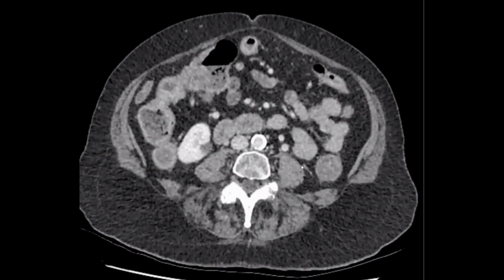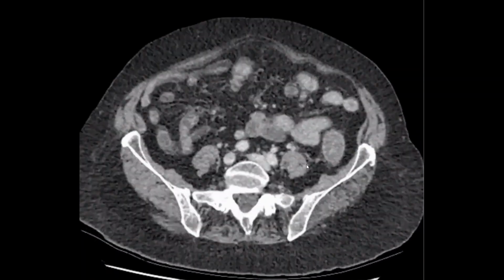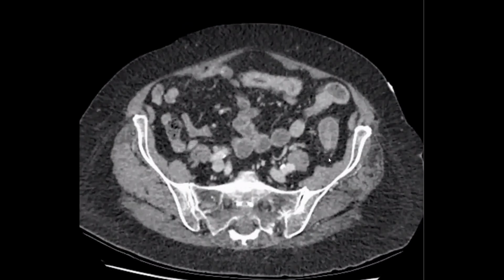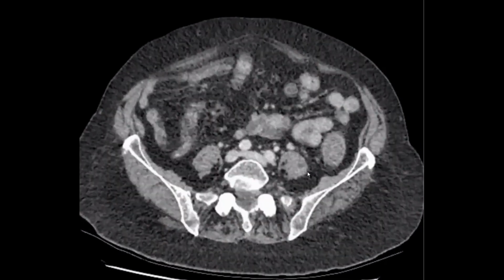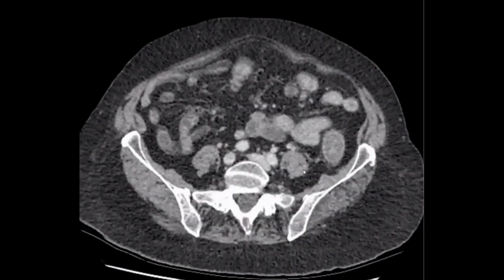You should suspect ischemic colitis. You should suspect inflammatory, also infectious disease. Iatrogenic or radiation-induced colitis is difficult here because I think it's not related; we don't have any primary tumor at this area, but you should also check if there was any radiotherapy before. But this is a long segment. Long segment. Post-radiotherapy effect will be segmental.